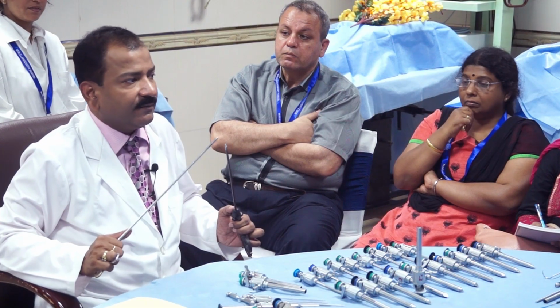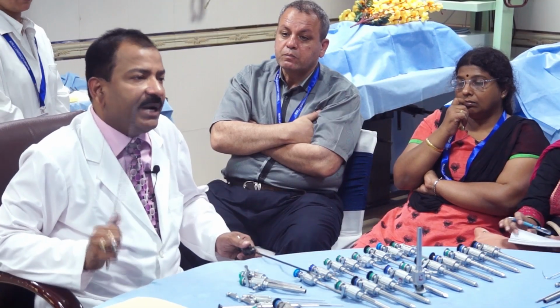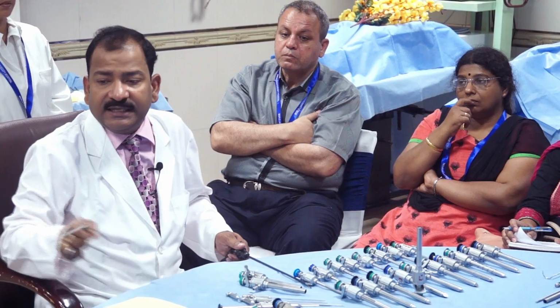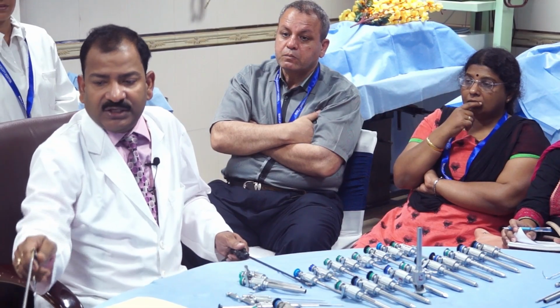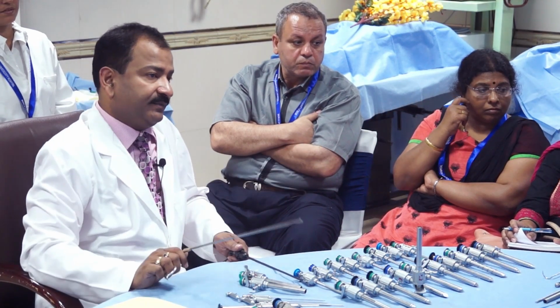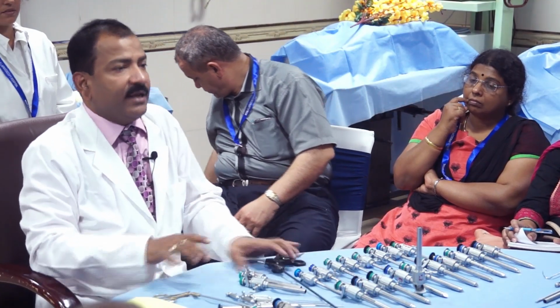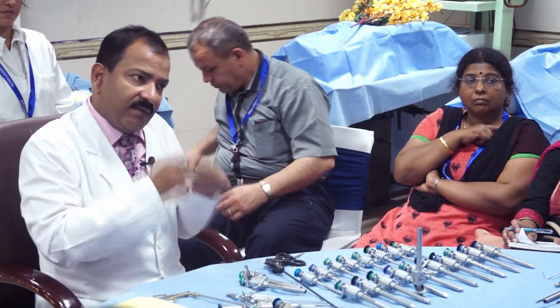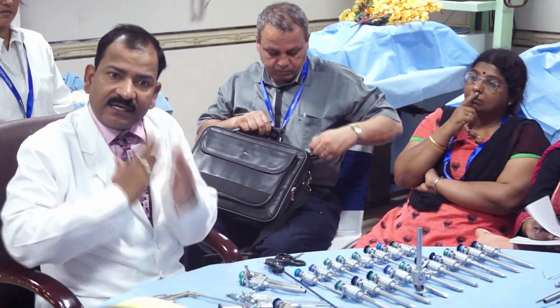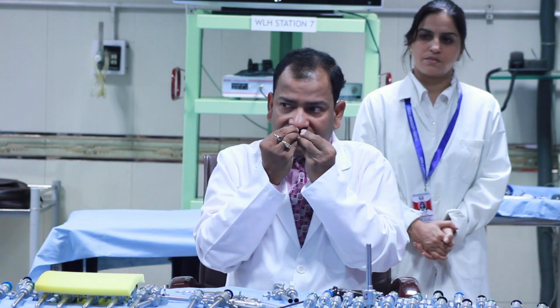60 degree. Whatever we do in our day to day life, we have a better angle if it is 60 degree. He is writing right now; if you see, both his hands are at 60 degree, her both the hands are at 60 degree, the angle between the hands. Even if you play a keyboard, or a drum, the sticks are at 60 degree. Even if you clap, 60 degree, even if you eat, 60 degree.